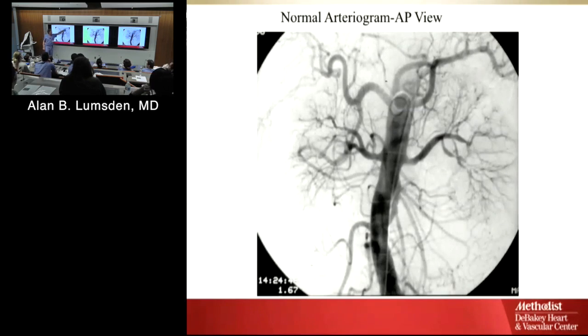Okay, what's that? Splenic. Common hepatic. What's this? That's the GDA. A duodenal ulcer sitting on top of this erodes into the GDA. You may get called. You come up here and put a couple of coils in to kind of block this off. Sometimes you have to come from the SMA in order to get into the hepatic artery. What's that?